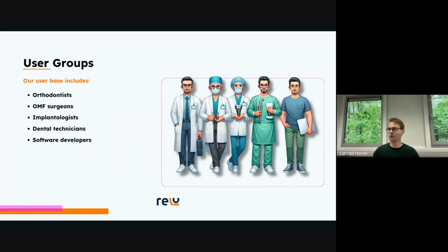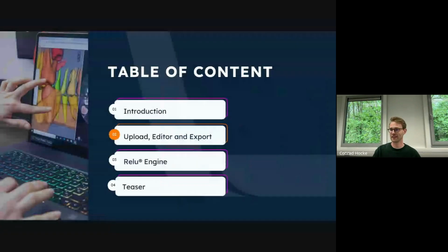We've learned that our biggest user groups inside the Relu Creator are orthodontists, OMF surgeons, implantologists, dental technicians, software developers from dental software companies. If you find yourself in those user groups, this webinar might be for you. Now let's head to the next part, to our main part. In this main part, we're going to start with the uploads.